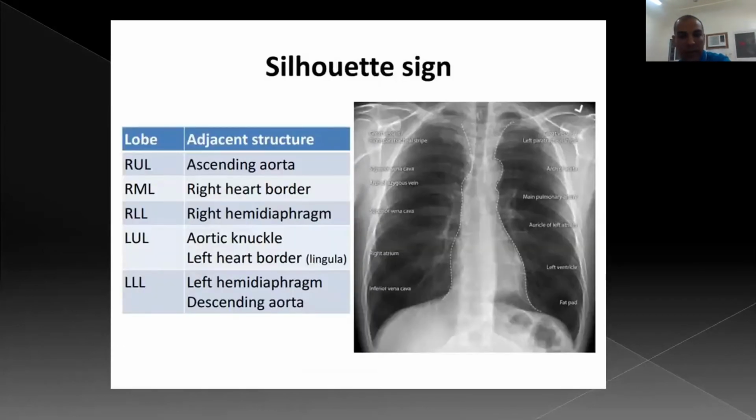Before we discuss the collapse, we should revise some points in the normal chest X-ray. To differentiate between different types of collapse, we should know where the cardiac border is. This is the left cardiac border, and this is the right cardiac border, and this is the right diaphragmatic copula, the left diaphragmatic copula, and the chest wall, and you should see the hilum bifurcating in its position.